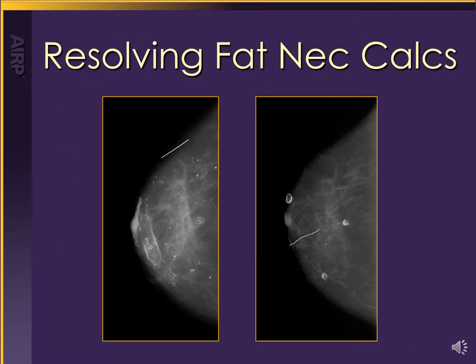Because this is part of a healing process, these rim calcifications are one of the ones that can actually go away with time. This was a few years after a reduction mammoplasty, and you can see most of those rim type calcifications have resolved.